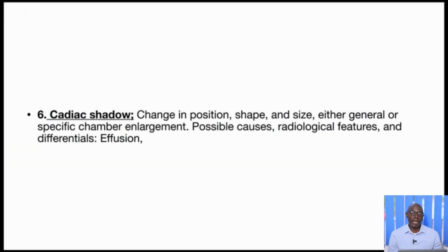So, going on to the cardiac shadow, again, a lot of work has been done on the cardiac shadow, and most of the heart issues are now handled with echocardiograms or even CT.